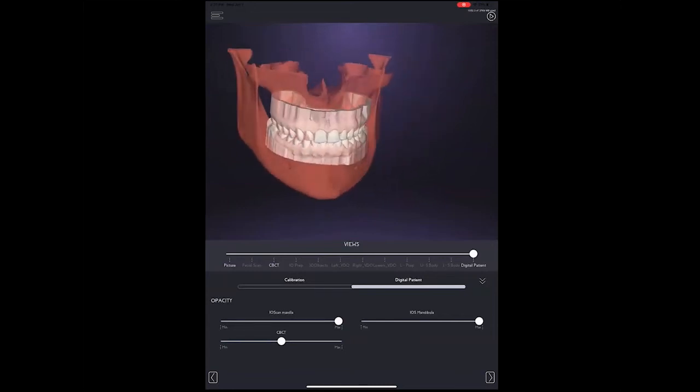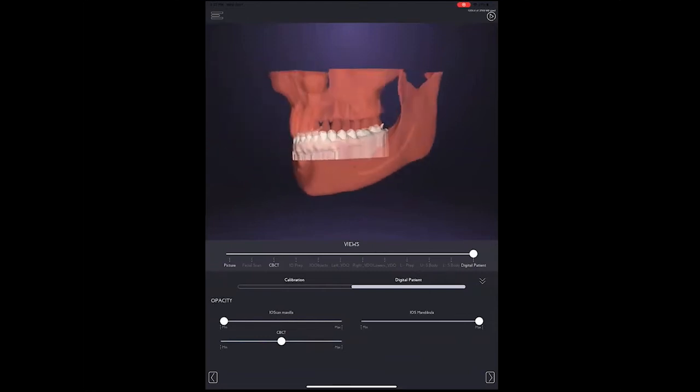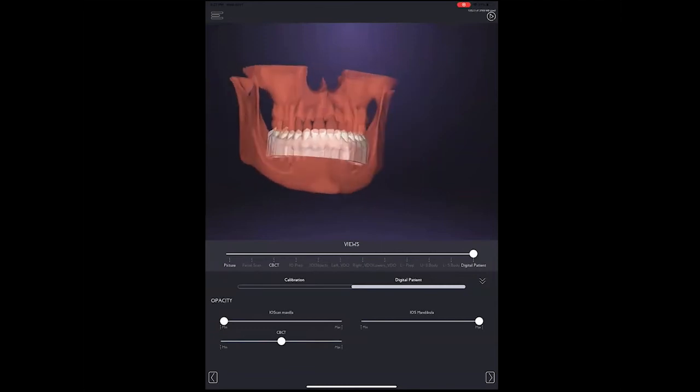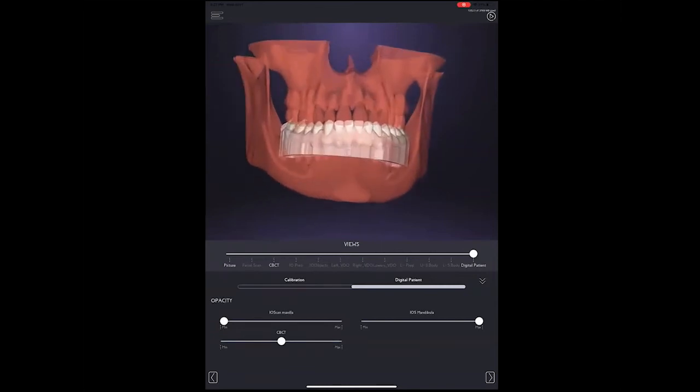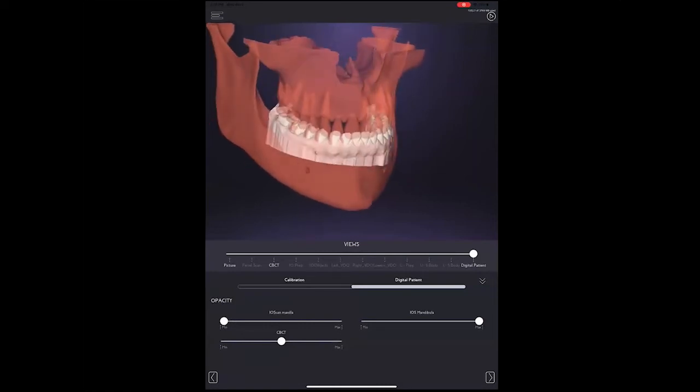And this is very rich information if you want to pass it on to other specialists that are working with you, because look at this, you can literally do your initial analysis just by looking at the patient's digital files.